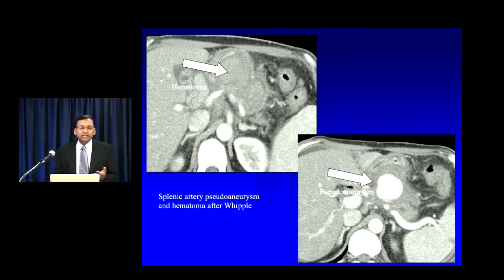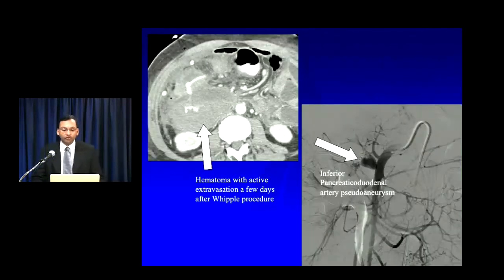Now, in most cases, the arterial phase may not help you, but in that 1 in 100 case where you're dealing with a large bleed and you want to find that subtle pseudoaneurysm or active extravasation, you will be thankful that you're routinely acquiring the arterial phase images as part of your protocol.